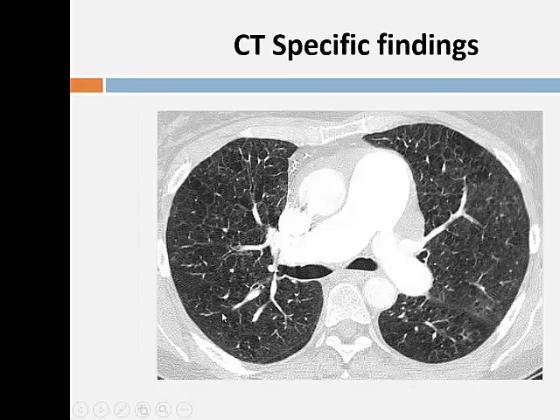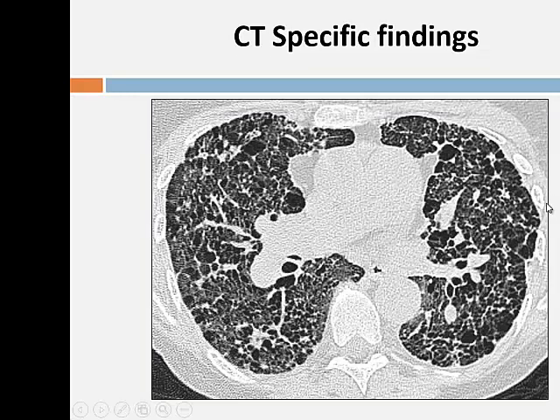So lung disease, what do you think the diagnosis is here? Looks like emphysema, yeah, so quite common. What do you think the diagnosis is here? Emphysema also? Okay, cystic lung disease, yeah? Multiple cysts. So you know in radiology it opens up your big differential of histiocytosis. What else? There's a classic four. So histiocytosis, LAM in women, and then things like tuberous sclerosis and neurofibromatosis, and those were with preserved lung volumes, yeah?